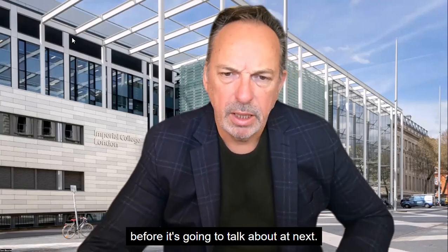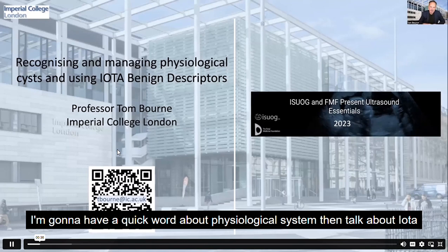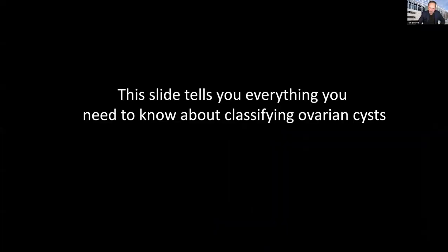Dirk's going to talk about adnex. I'm going to have a quick word about physiological cysts and then talk about IOTA benign descriptors, which we think are the first things you should use when trying to classify a mass. And after, if the descriptors don't apply, then as Dirk will describe later, we can use the IOTA adnex model.